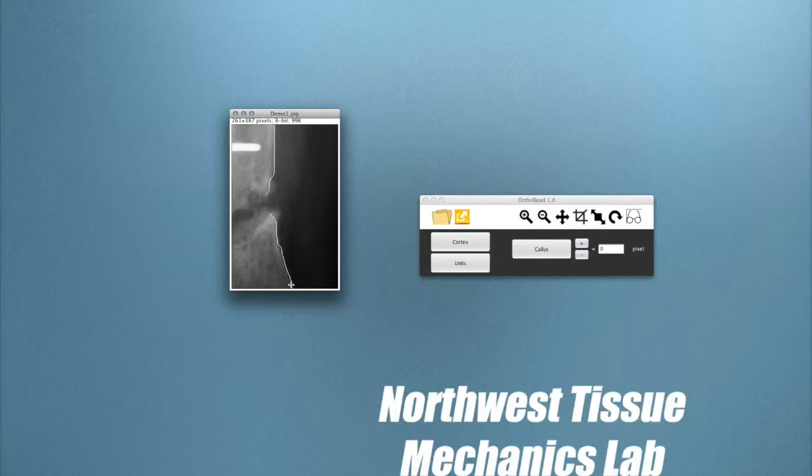You will notice that OrthoRead has automatically segmented the cortex for you. Once you verify that the cortex selection is accurate, we move to the next step by again right-clicking or two-finger clicking for the Mac trackpad users.